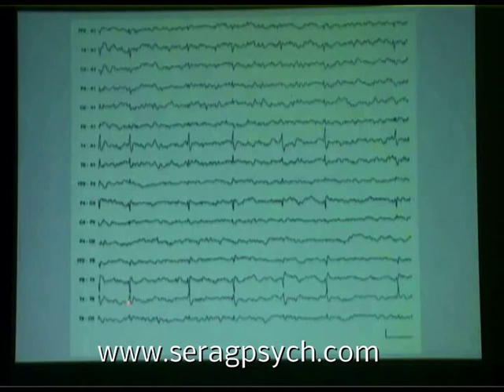Whereas in this circumstance, this is primarily in the neocortical part of the temporal lobe, clearly phase reversing without any hesitation whatsoever at T4. You can see the difference between that and the anterior mesial temporal spikes I showed you several minutes ago. Next, please.